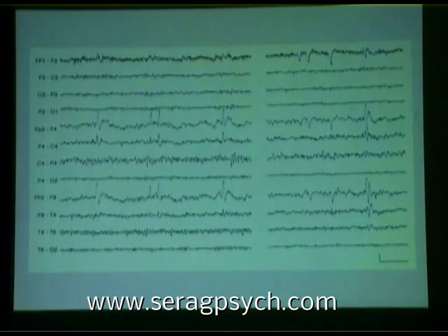Next, please. Now, these are not temporal lobe spikes. Notice that they're very distinctly not. So we have left parasagittal, right temporal. And notice that these are electronegative at F4. F4 is electronegative, goes up to C4, but FP2 is even more negative than F4. So these are right frontal polar spikes, okay?